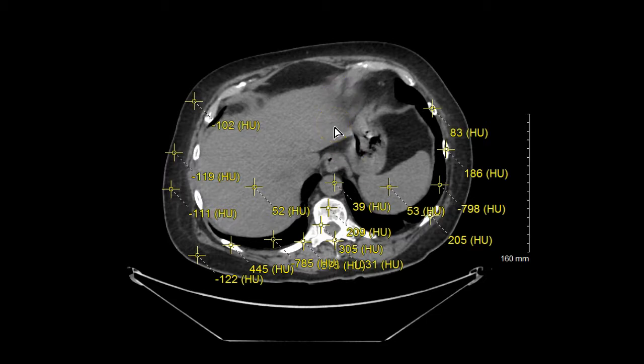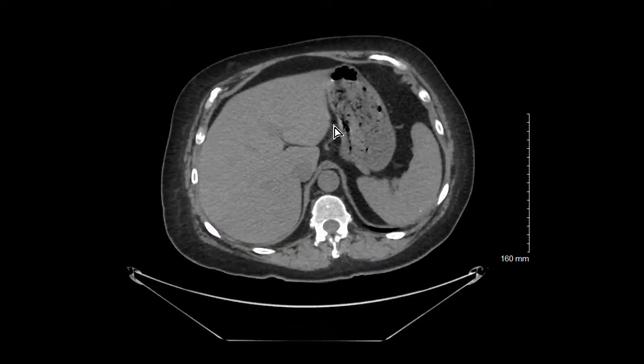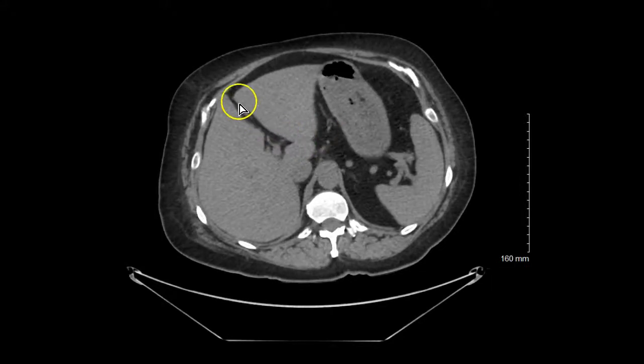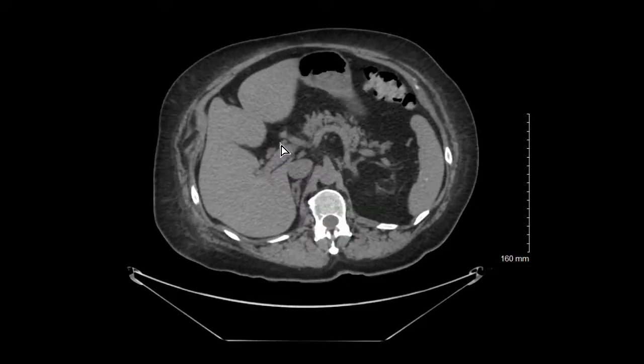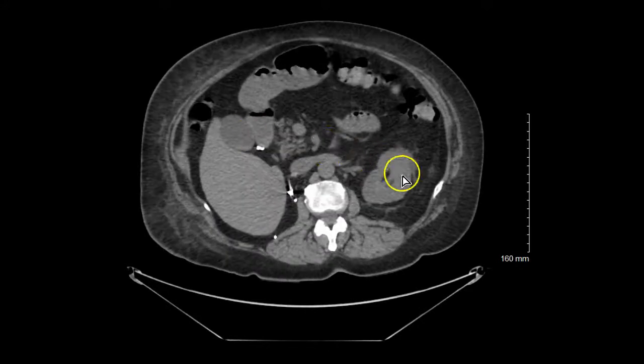As we continue, instead of just one point, we can scan through and see different structures that are associated. I just want to go down a little bit more so you can see some of the differences. You can see the falciform ligament essentially dividing the two lobes of the liver right through this region. Here you can see the structure of the gallbladder, and then you also can see the corresponding kidney. This happens to be the left kidney, so anatomically just remember the liver is on the right, the kidney's on the left, so we can see those structures.